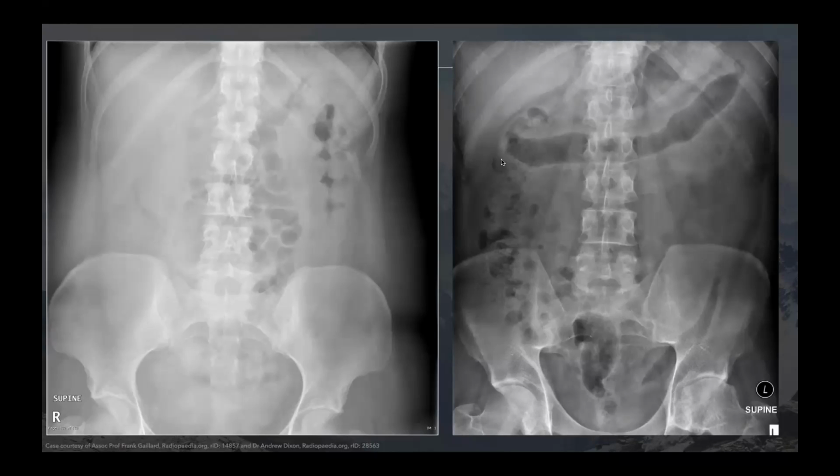So this thing here is called lead pipe bowel, and it's this long segment of completely featureless transverse colon. This is the consequence of repeated episodes of acute inflammation. There's also, if you're working through your structure here, another clue that this patient has inflammatory bowel disease, which is that the SI joints are fused. So on the left here, you can see there's joint space, but on the right, that's all obliterated. And that's a consequence of an enteropathic arthritis, which is one of the seronegative spondyloarthropathies. And you get fusion of the SI joint.